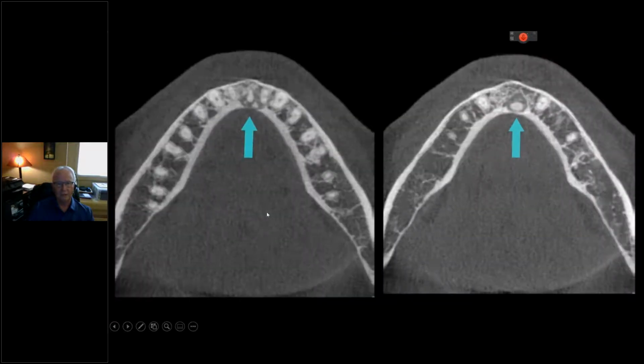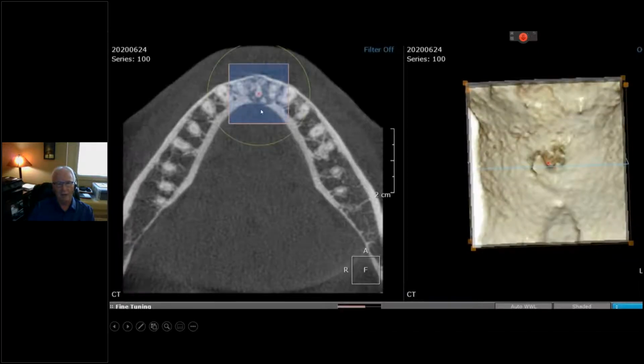So, mature stage PCD. I have seen cases where there have been several lesions at different stages, of course, in the jaws. This is actually all one lesion. This is a little bit more inferior on the right, a little bit higher up on the left, and you can see there's opacities within a radiolucency. This is not the root end. This is another mass of material within the lesion. They sometimes resorb.